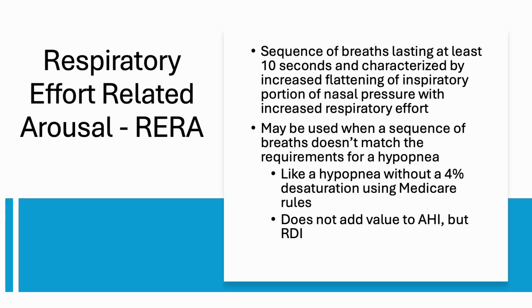In instances where a patient is having hypopneas or just arousals or 3% desaturations and aren't scorable because of Medicare or Medicaid, you can score them as RERAs, respiratory effort-related arousals. Also, there is the added allowance that the airflow signal doesn't have to match 30% minimum airflow signal loss the whole time. The true RERAs that occur are all about the effort. The effort continues to increase and increase until an arousal occurs.